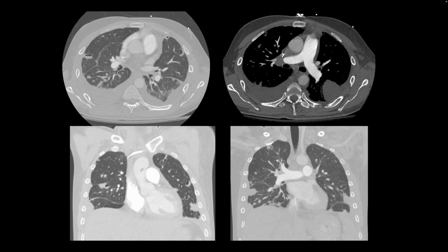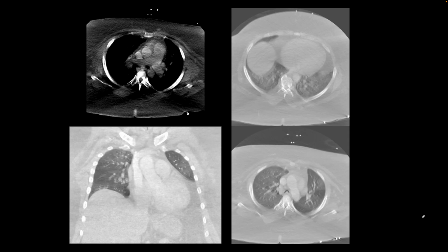This is a companion case, and this case shows findings that are consistent with septic pulmonary embolism. In those patients, we don't typically see filling defects in pulmonary artery branches, but since the infective emboli go through the pulmonary artery branches into the lungs, we see findings suggestive of lung infection. So there are multiple bilateral cavitary lung nodules, and there are bilateral reactive small pleural effusions. And those findings are also seen on these two coronal images. So remember, septic embolism.